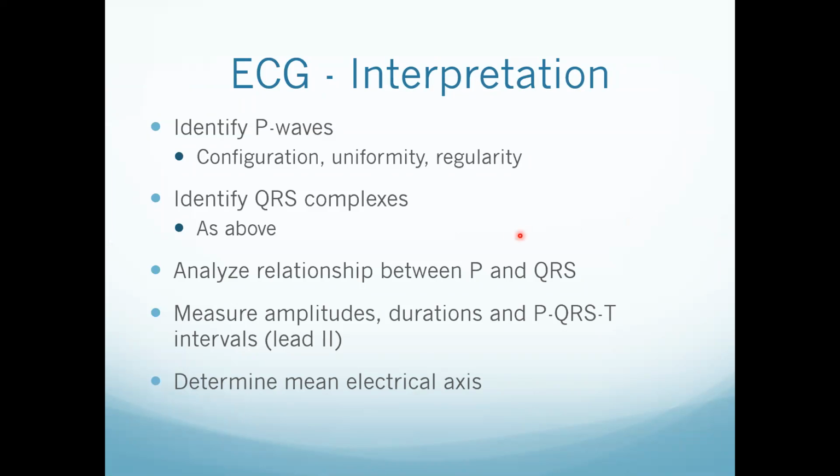And what's really important, particularly for identifying if arrhythmias are supraventricular or ventricular in origin, is to look for an association between the P wave and the QRS. Supraventricular arrhythmias are pretty much always associated with atrial depolarizations, and so there should be a fixed PR interval. It's just not always apparent because the P waves might be hidden in the preceding T waves. Whereas when we're dealing with ventricular arrhythmias, there's no association between P waves and QRS complexes. So the P waves that you do see do not have any fixed relationship with the abnormal QRSs that are present.